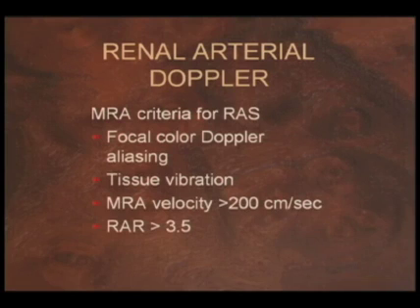There's a variety of criteria that have been established. These are the ones that I rely on most heavily. One is on color Doppler imaging, detection of focal flow abnormalities that include focal aliasing of the Doppler signal and focal vibration of the perivascular tissues around the stenotic site.